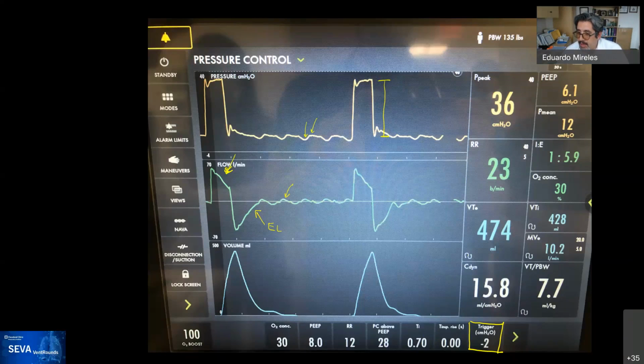Very good. Excellent, Uri. There is also the dog ear overshoot, due to the low IRT in the setting of increased elastic load. So I presume that you talk about this overshoot, Ibrahim, and indeed, this is a manifestation of the pressurization. So the machine pressurizes, and then you have this oscillation, and it's part of the inspiratory rise time, and you may have the oscillation, which means nothing, and it doesn't cause any injury in general to the airway or the lung.